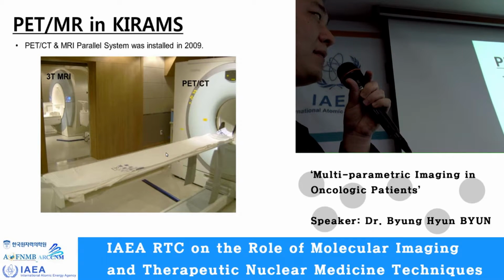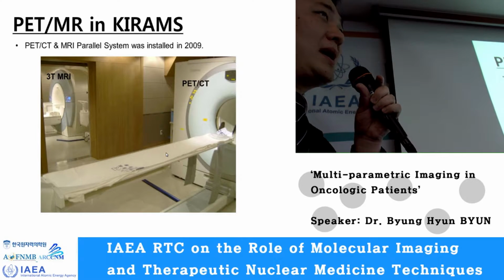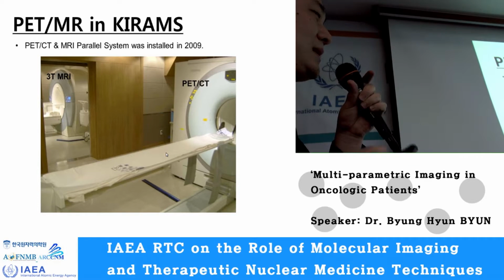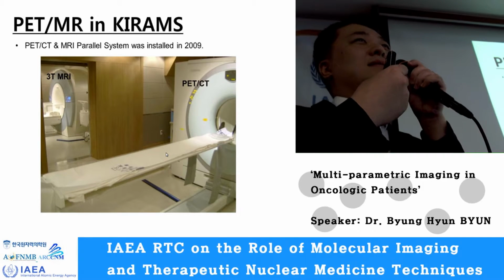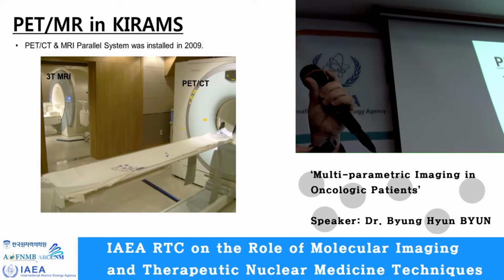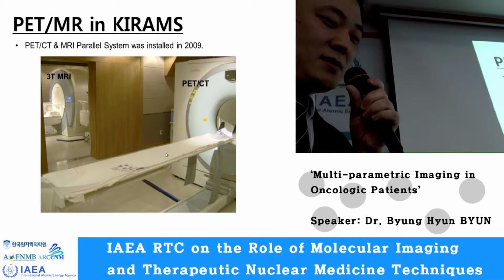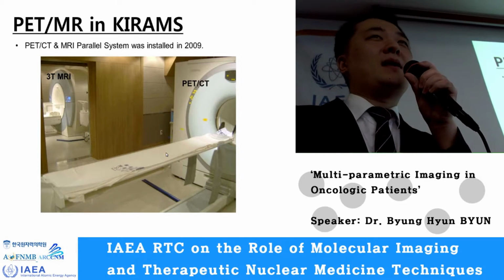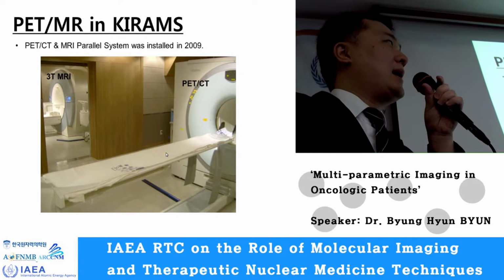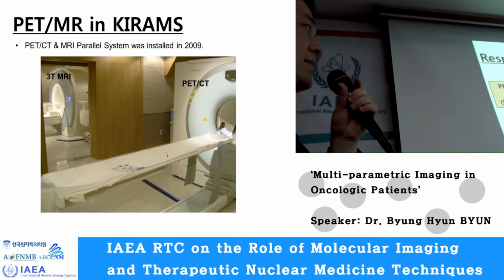After the PET-CT scan, the patient walks to the MRI. So these two images are co-registered by using software. In our experience, it was sufficient to study PET MRI studies. I will show you some examples.